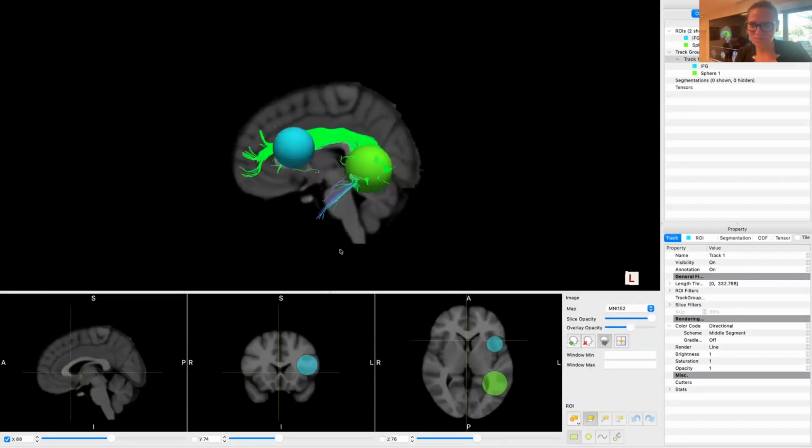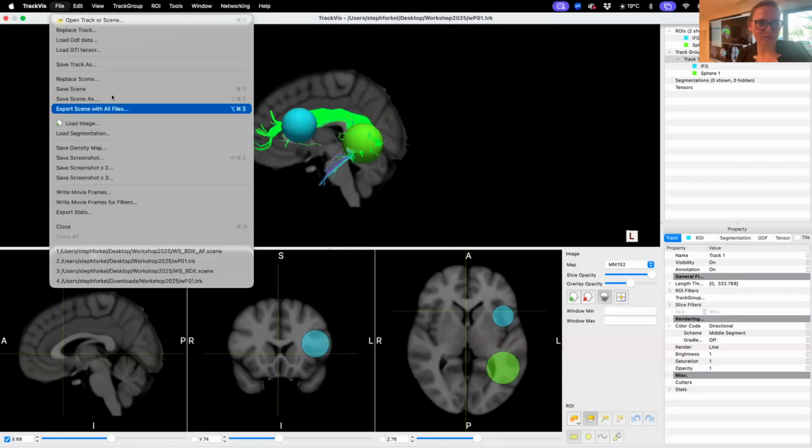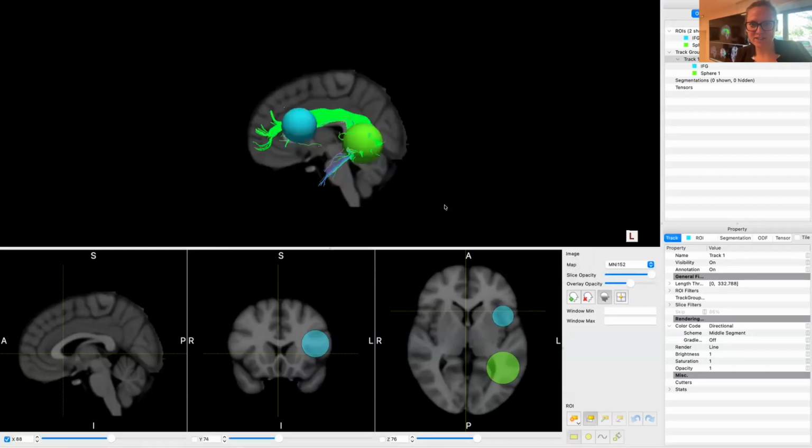Here we go. So I'm just not going to rename anything anymore. It's just not liking it for whatever reason. But I will try and change the color.